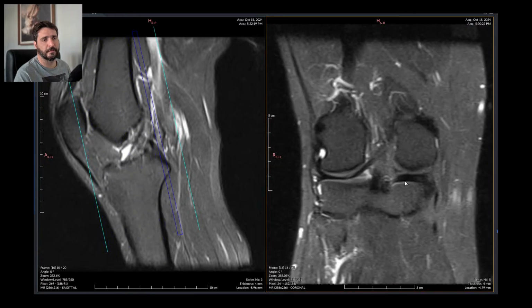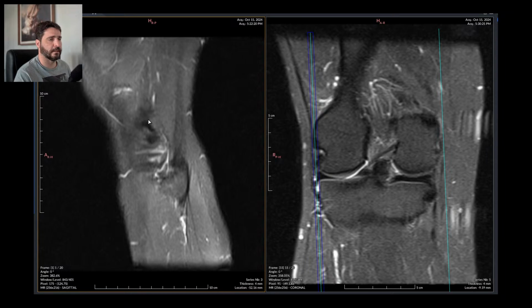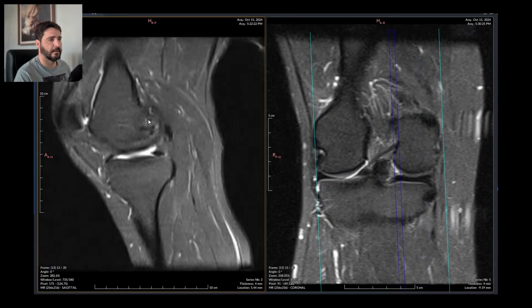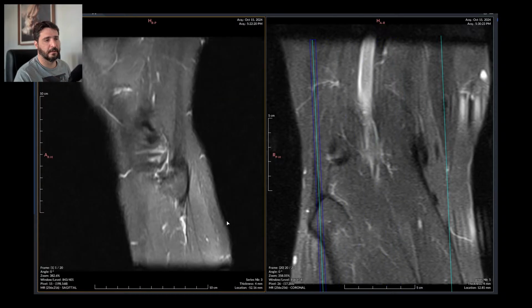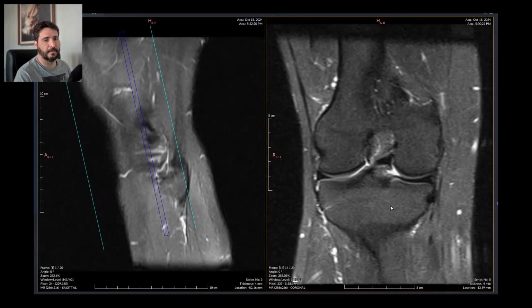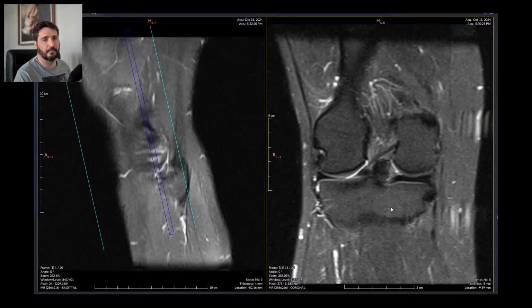Let's just roll over the bones to see if there is any contusions, any signs of trauma. No signs of trauma. The technician seems to hate fibulas because he didn't image the entire fibula. He just missed it because no, it's just a bone.